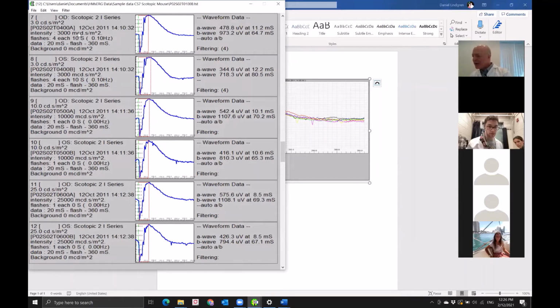Can you also compare graphs from different measurements, like a baseline and end measurements of a study, or only within one measurement? Okay, if I understand the question, it sounds like if I capture data today and then I want to capture data in 2 weeks, can I bring both of those together and do an analysis so I can look at what's changed over the 2 weeks? If I understand the question, yes, we can do that.